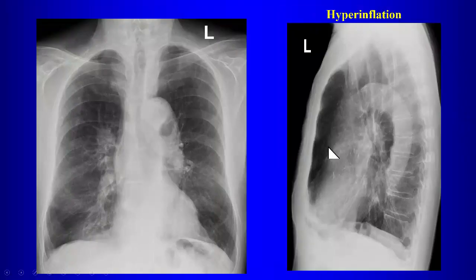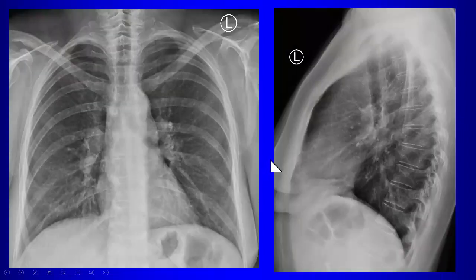So again, hyperinflation on a chest radiograph should increase your index of suspicion because it might imply the patient's a smoker. So you have to be careful. Of course, the likelihood of cancer is higher in those patients. We get a little bit more subtle. What about this?